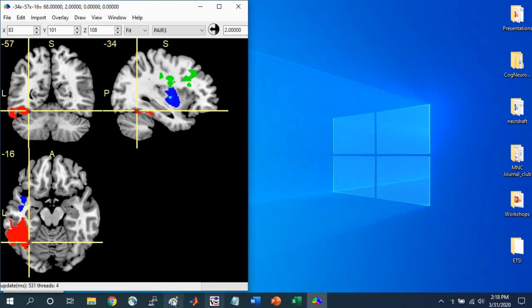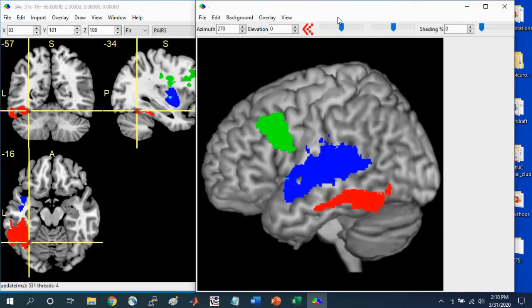Okay, so the last thing I want to do is go over which cognitive deficits are associated with these lesion pairs, as I promised I would do. So I'm going to go to Window, Render. Generally speaking, the two patients here with brain damage consistent to this region had spoken production deficits. This is also termed Broca's aphasia, and it tends to be found in individuals with damage to the left inferior frontal gyrus.